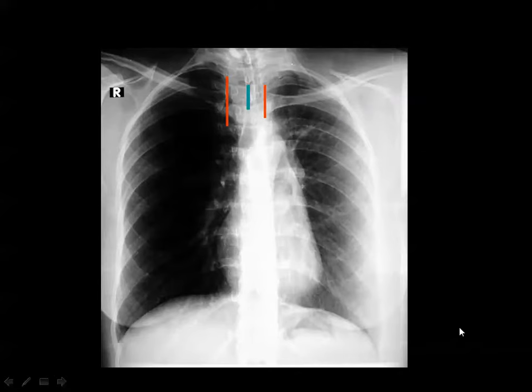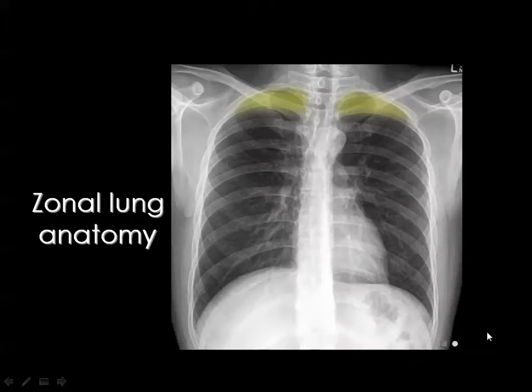Because of this rotation, one of the lungs is hypertranslucent and one of the lungs is veiled, because one of the lungs is closer to the film than the opposite lung. And before misinterpreting this as emphysema or this as pneumonia, you should look carefully at the patient position.